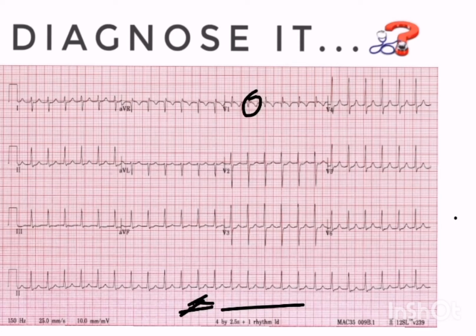What happens in an AVNRT is that the P wave that is produced is most of the time buried inside the QRS complex. But in some cases, when it is not buried inside the QRS complex, it is present outside. But it must be present within 80 milliseconds of the QRS complex, so the RP interval must be less than 80 milliseconds. But in AVRT, the P wave is present quite far outside the QRS complex, and the RP interval is more than 80 milliseconds. So this characteristic ECG is of AVNRT.